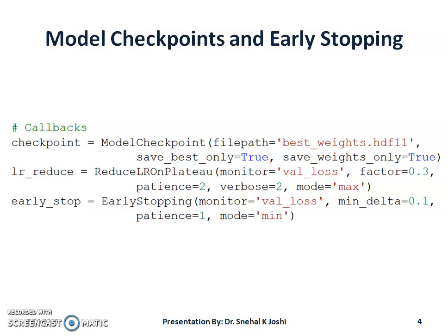That is all needed to ensure the model with the best performance is saved when using early stopping or in general. It may be interesting to know the value of the performance measure and at what epoch the model was saved. This can be printed by the callback by setting the verbose argument to 1.